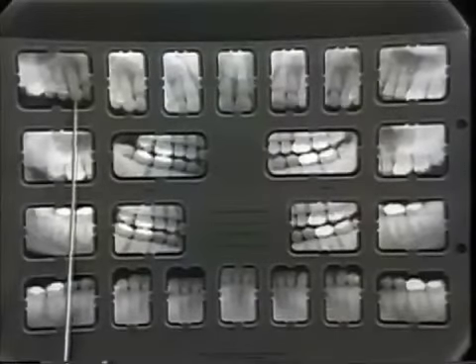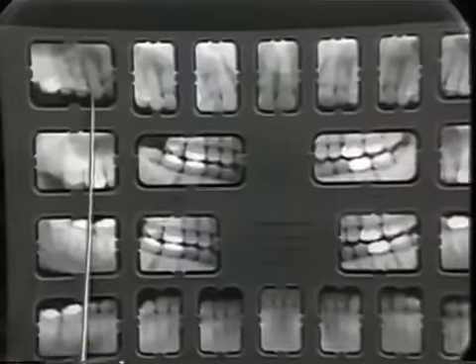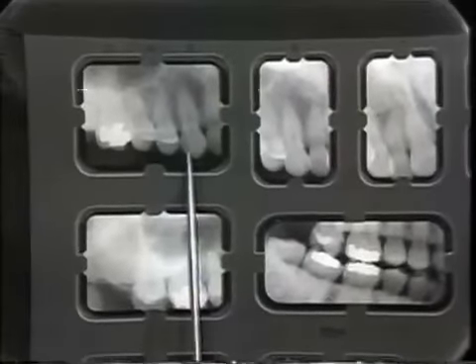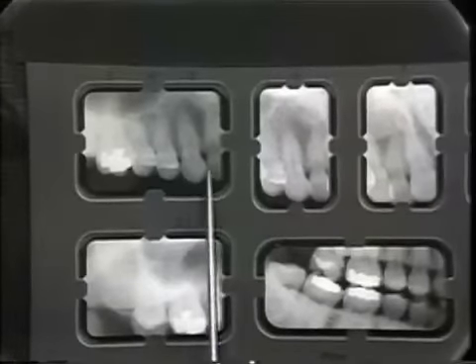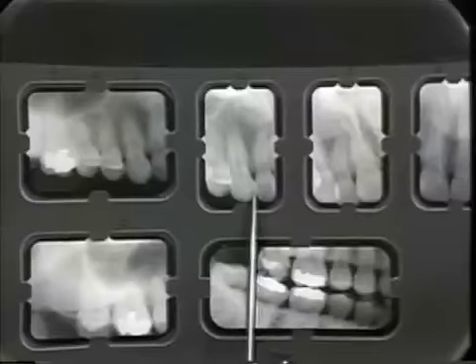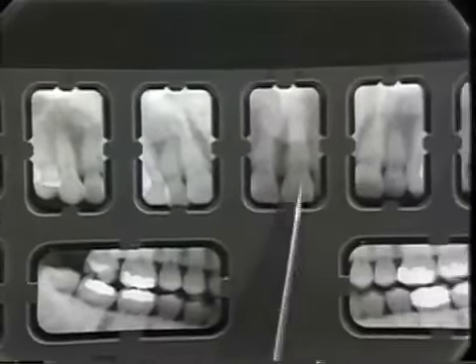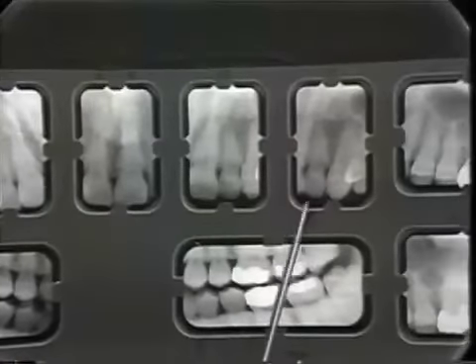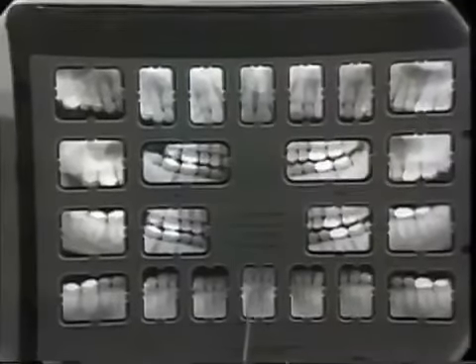In order to record the carious findings on the complete mouth or radiographic findings, we should look at the anterior region. The distal of number 6 in particular, which is difficult to see sometimes in the posterior bite wings, can be seen very clearly here. And we will follow along and look at the interproximal areas of the anterior teeth, including the lower anteriors. In this case, all these teeth appear to be clear of carious lesions.